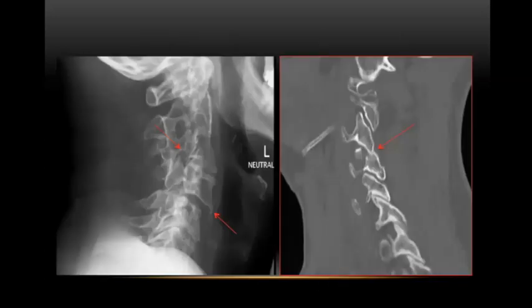All right. So kalau macam ni, you can see it's less than 50% of the vertebral body, and you have the bow tie appearance. Right. So this is the anterolisthesis of C4 over C5, and you have the locked facet there.